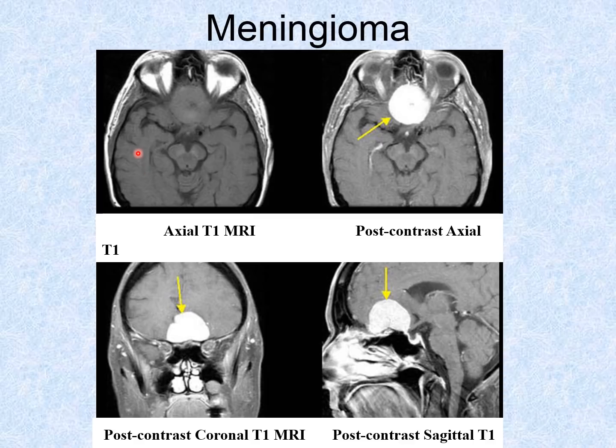A meningioma seen here in the frontal lobe can be seen both in an axial T1 image. You can see it because if you know the anatomical structure, but it would be hard to appreciate it. But if you look at the post-contrast inject material that will tend to highlight such masses, we see in this contrast material in MRI that you can see the tumor stand out like a sore thumb at the base of the frontal lobe, here and here.